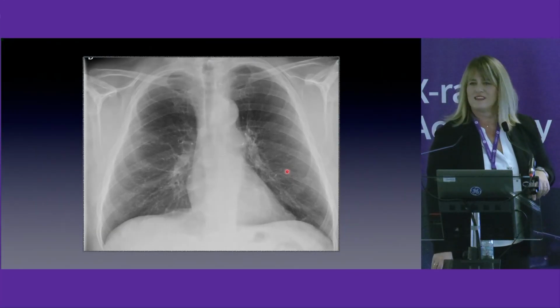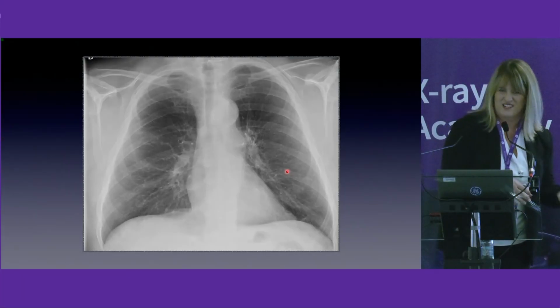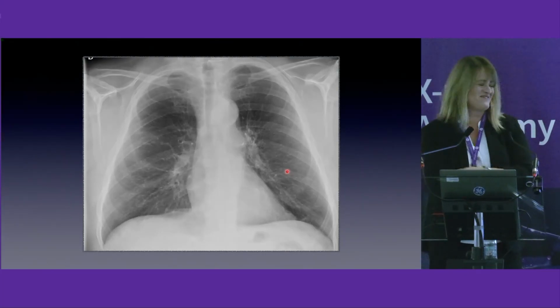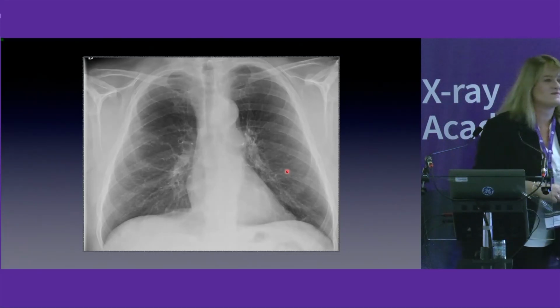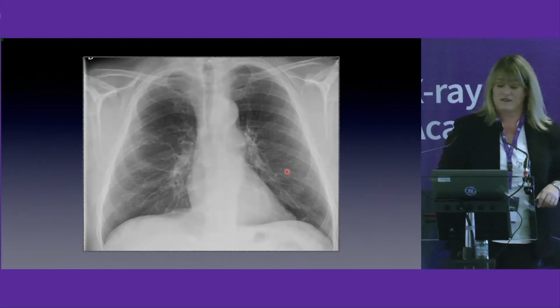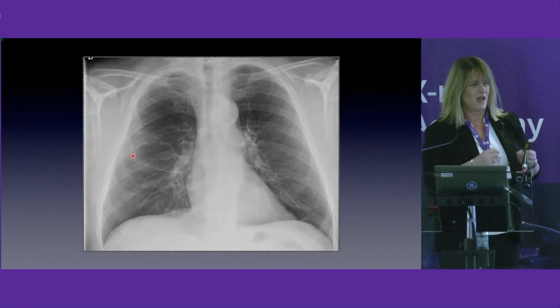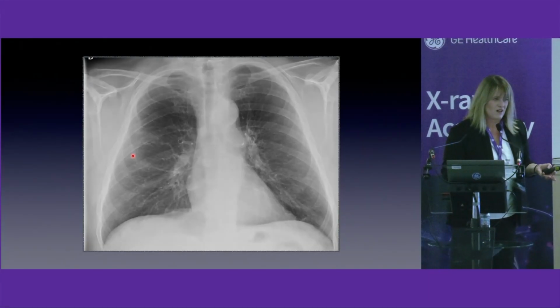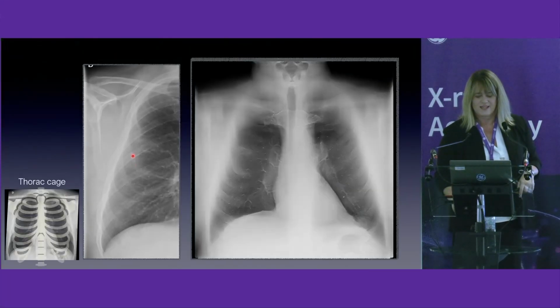Yes, I know, I'm just taking a lot of time, is that okay? Okay, so we can discuss cases here. Thank you. Just stop me, okay? Yes, there is a difference. My attention was about here because I see a smooth opacity, but I can't say anything else. So we perform DTS.